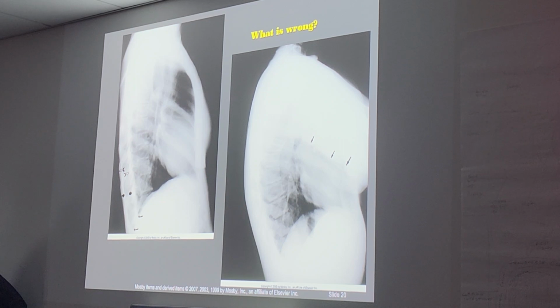Oh, they just got a long neck. I wonder if he has an extra C-spine. So you can say too high because we see C7 over here, and Monty said that the costophrenic angle is over here, getting cut. Is it getting cut off? No, it's very close to the bottom of the image.